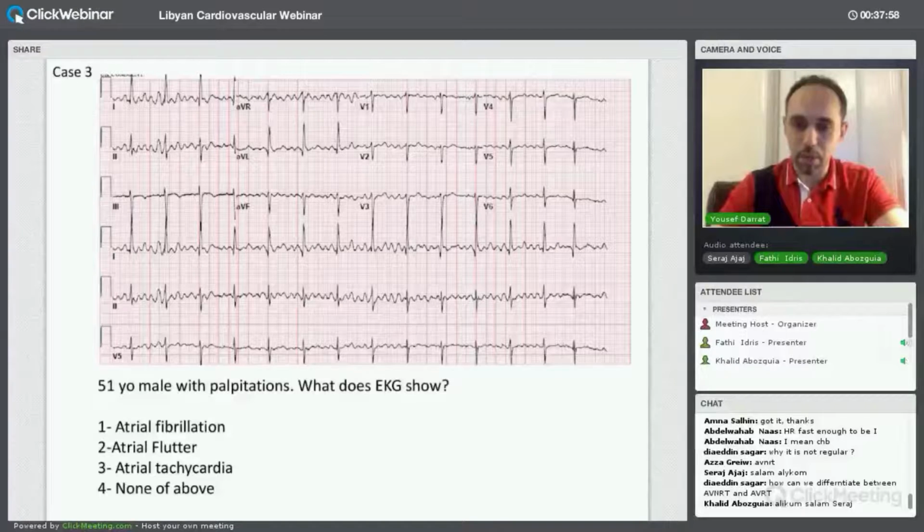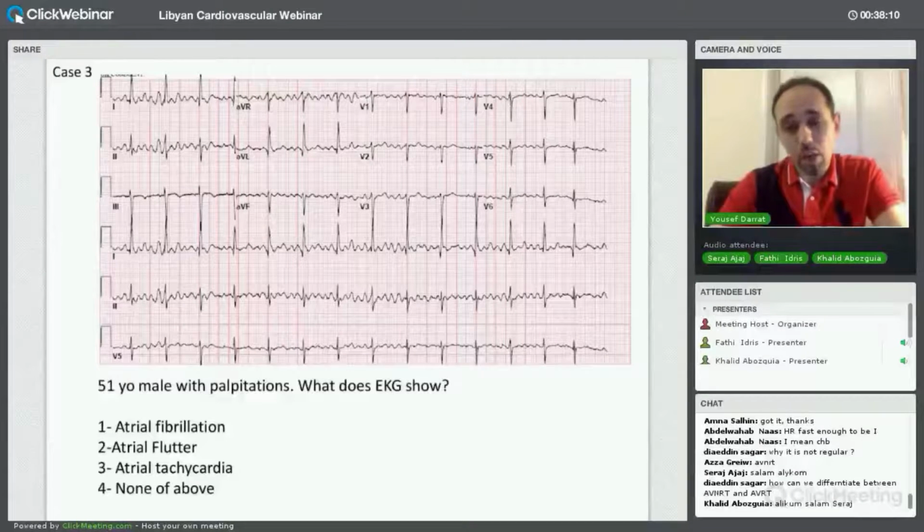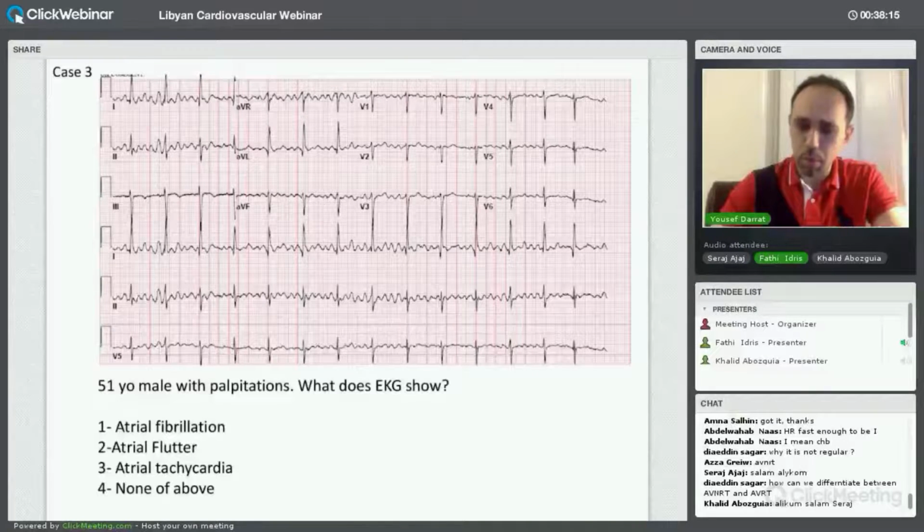If the patient has a narrow complex tachycardia and their baseline EKG shows a short PR interval and delta wave, WPW, then that's suggestive of AVRT. If the EKG looks completely normal, it cannot rule out AVRT, because the patient may have a concealed pathway by which they conduct retrogradely only and lead to orthodromic AVRT. One way on the EKG is if you can see a P wave and the V to A interval is kind of wide, that might be AVRT. If it's really short and you can't see a P wave, I would go most likely with AVNRT, but definitively an EP study.